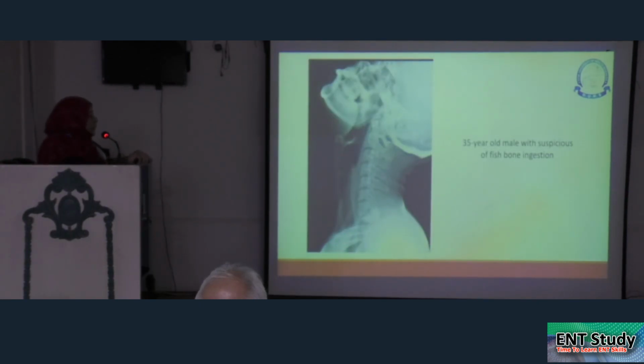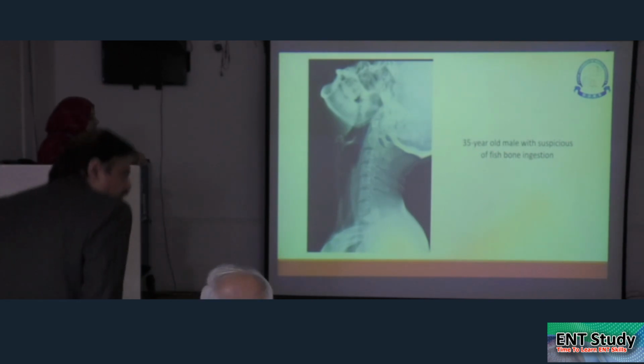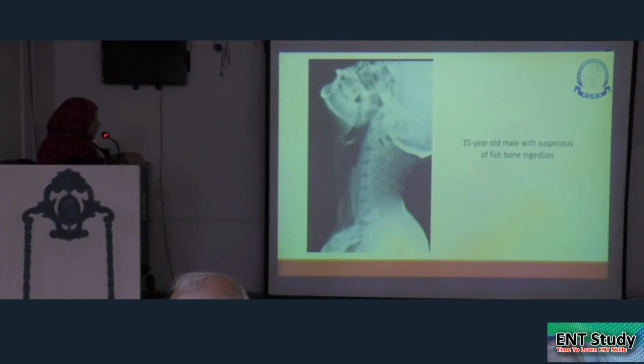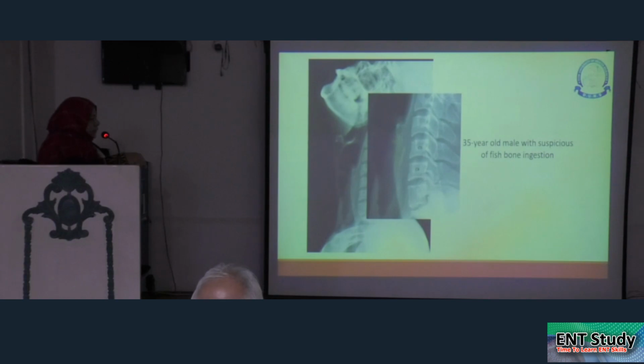This is an X-ray of a 35-year-old male with suspected fishbone ingestion. It clearly shows a linear foreign body at the level of C5, C6.